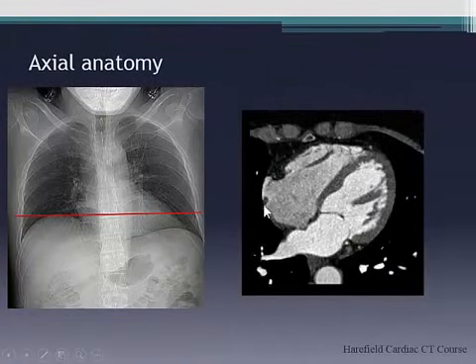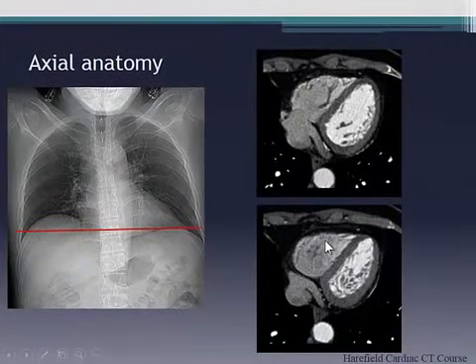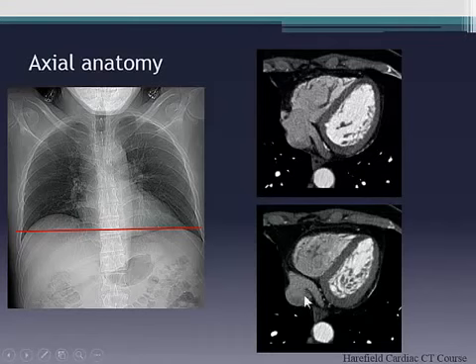Moving down further, you can see the crista again, and here we're getting the inferior pulmonary veins. And then as we start coming off the heart, you can actually see the coronary sinus. And you can see the coronary sinus and the IVC. So you know the three structures draining into the RA. We've already seen the SVC, IVC, coronary sinus. And you can see that quite nicely.